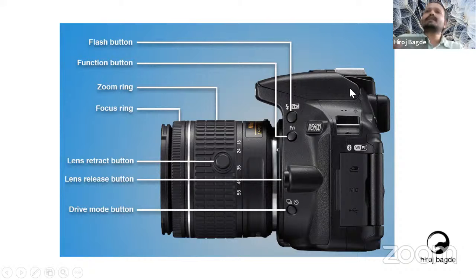But I suggest not to utilize this because of the color, and the color temperature inside this is a bit difficult for us to diffuse and to get a proper white light for macro art photography. So I don't recommend this to be used. Then we have the functionality button.